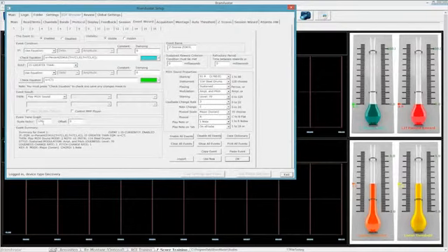For example, in this one right here, if we're doing PZOK, we're looking at a percentage range. If we're doing amplitude training, it'd be microvolts. If we were doing region of interest amplitude training, it'd be nanoamperes per cubic millimeter. So it doesn't really have any value by itself; it has the value of a unit, and depending on what you're using and what you're training, it's going to change.